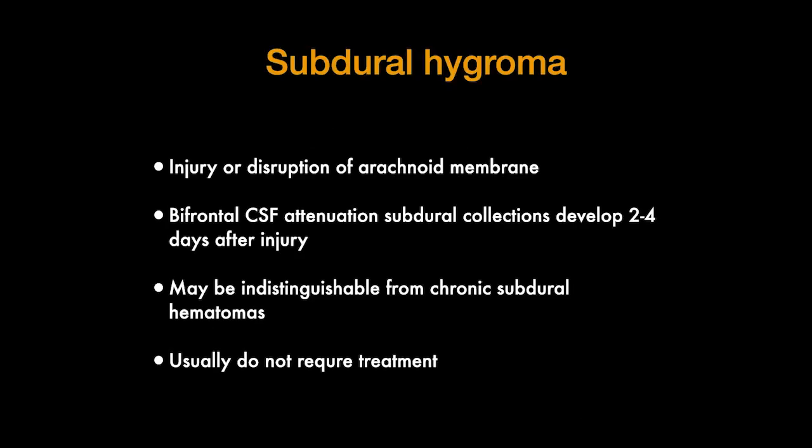Subdural hygromas are due to injury or disruption of the arachnoid membrane without hemorrhage. They are CSF in attenuation. They're usually bifrontal, and they usually develop 2 to 4 days after a head injury. These can be indistinguishable from chronic subdural hematomas, but the timing usually tells you that it's a hygroma. These usually do not enlarge or require treatment.